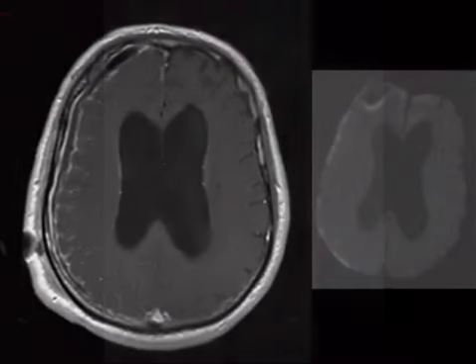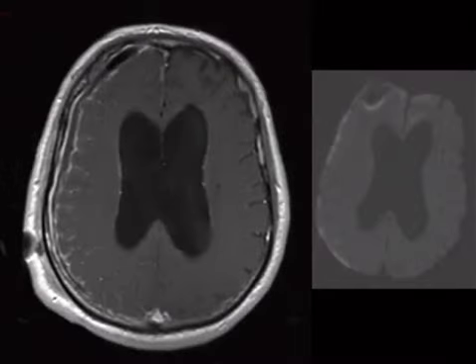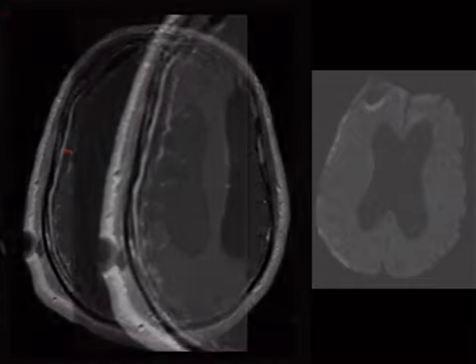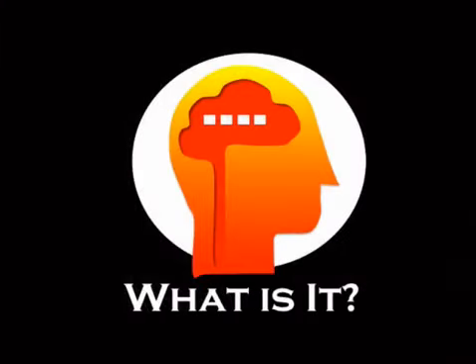Okay, next case, another diffusion case, and you're seeing this subdural-looking thing that's restricted diffusion, and that is a classic way to tell you that there's a subdural empyema, a fluid collection there that's infected. So, it's this stuff here. We can see dural and leptomeningeal enhancement, and corresponding restricted diffusion, so that's pus. Boom. All right.